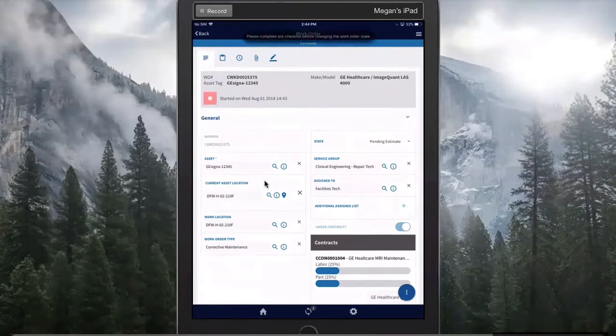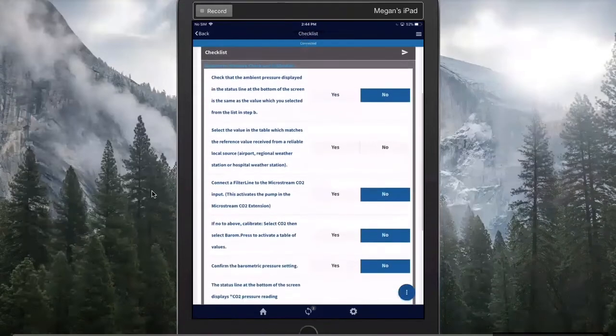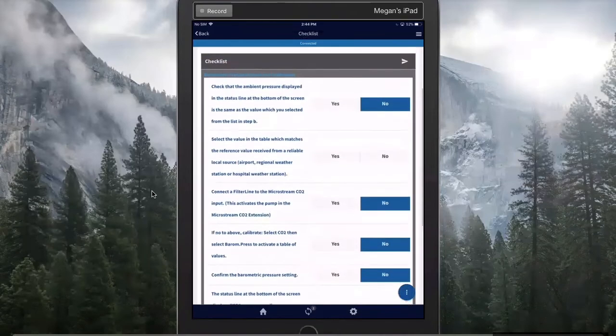All right, so I'm just going to flip through some of these tabs here. What we're looking at now is a procedure checklist. Procedure checklists would be relevant here for preventative maintenance work orders or very specific onboarding, inspection, and safety checklists, that sort of thing. So then you can digitize these checklists so they're not looking for their service manuals in paper format anymore. And it's all right here for them.